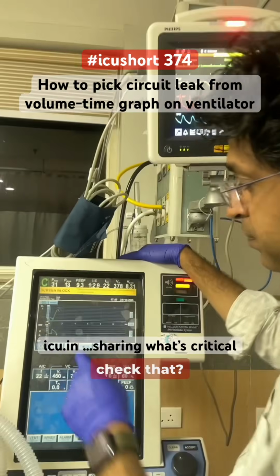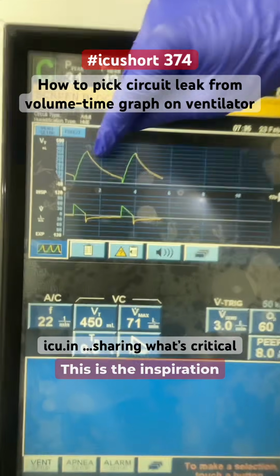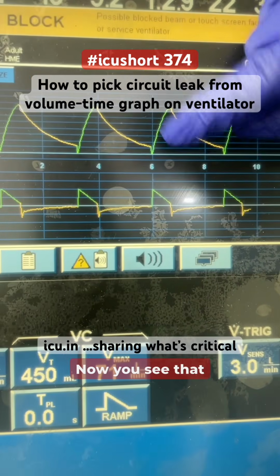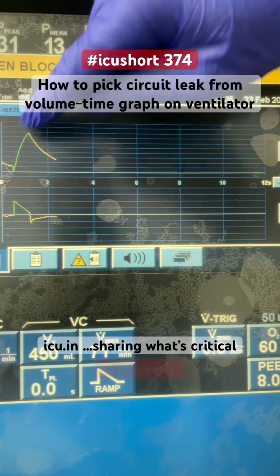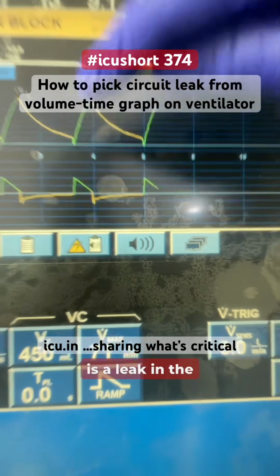So how will we check that? This is the volume time scalar. This is the inspiration and this is the expiration. Now you see that the expiratory limb is not touching the baseline. Inspiration starts and expiration is not touching the baseline. That means there is a leak in the circuit.